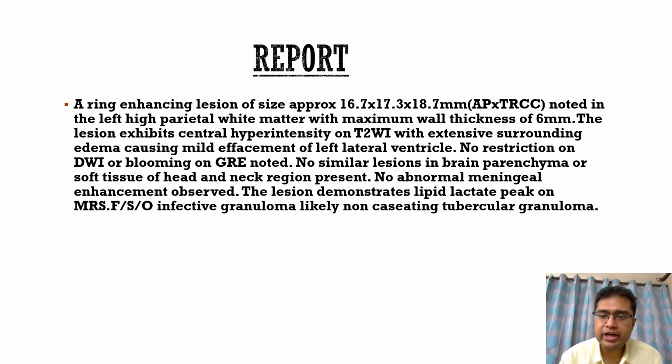So the lesion demonstrated a lipid lactate peak on MRS. So always try to get an MRS done in case of an infective granuloma, because it is always better to differentiate all the ring enhancing lesions at once based on MRS. And the features were suggestive of an infective granuloma, likely a non-caseating. So it is better to give the stage also of the tubercular granuloma and what type of tubercular granuloma it is, whether it is caseating or non-caseating. This is actually a non-caseating, based on the central T2 hyperintensity that was seen.